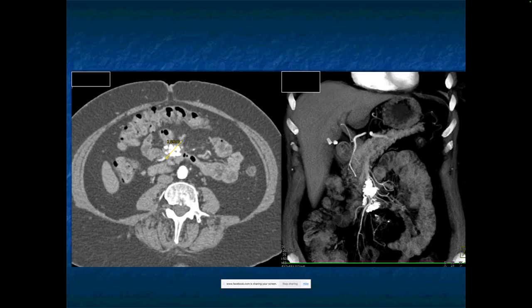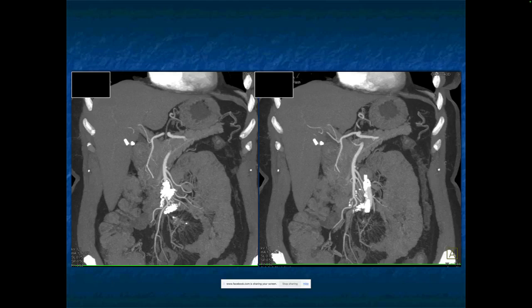What are we dealing with here? Well, you're dealing with a calcified mass, and you say to yourself, what could this be? It could be sclerosing mesenteritis. That's a mass in the mesentery, no significant desmoplastic reaction. Carcinoid tumor, 70% calcify as well. So you say to yourself, I have a mass in the mesentery that's calcified.